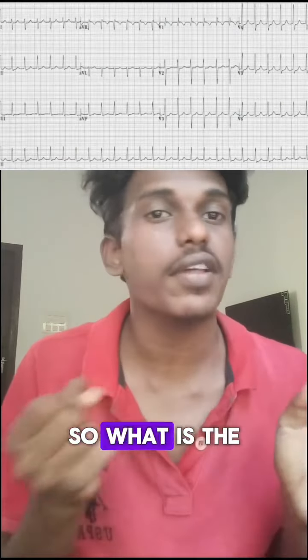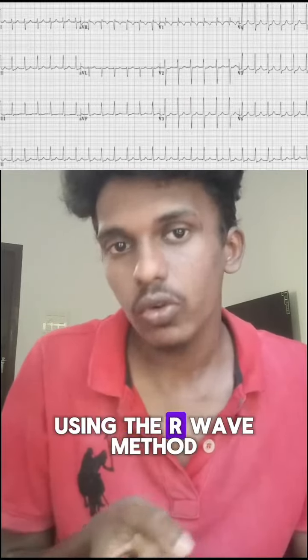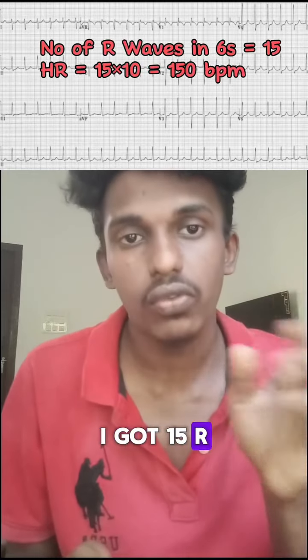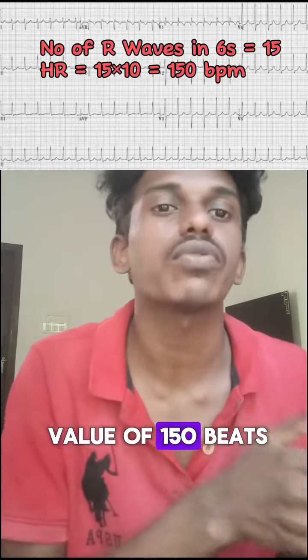In this video, let's discuss this ECG. So what is the rhythm? The rhythm is regular. Now the rate, I'm using the R wave method. So I'm taking a 6-second portion. I got 15 R waves. So 15 into 10, it will give a value of 150 beats per minute.